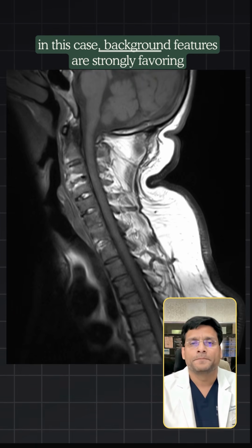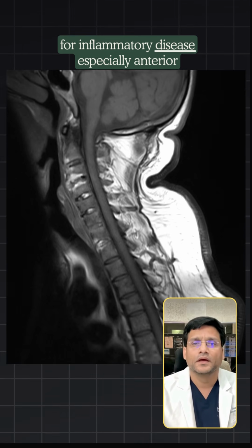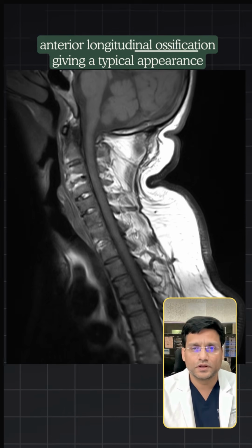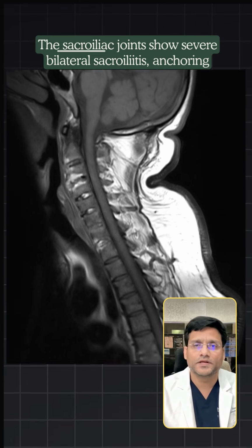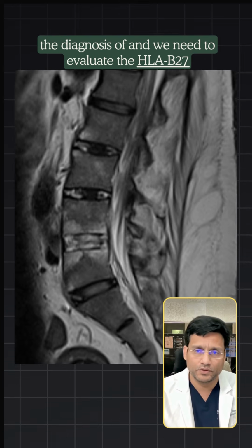However, in this case, background features are strongly favoring inflammatory disease, especially anterior flowing marginal ossifications or anterior longitudinal ossification, giving a typical appearance. The sacroiliac joints show severe bilateral sacroiliitis, anchoring the diagnosis of ankylosing spondylitis, and we need to evaluate the HLA-B27.